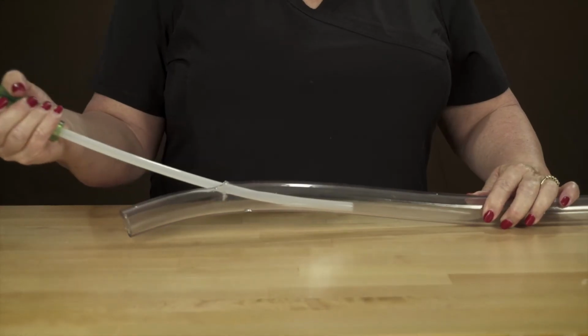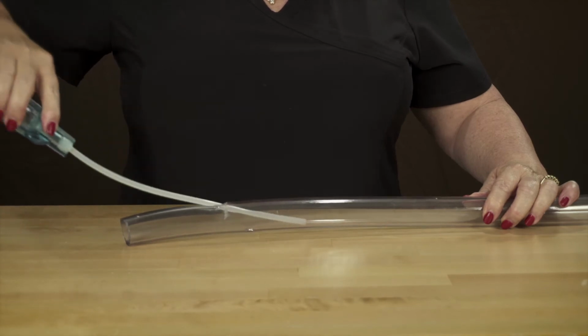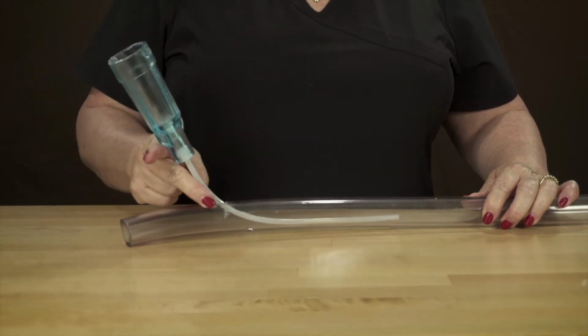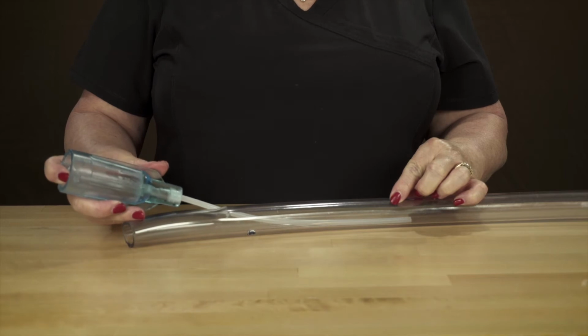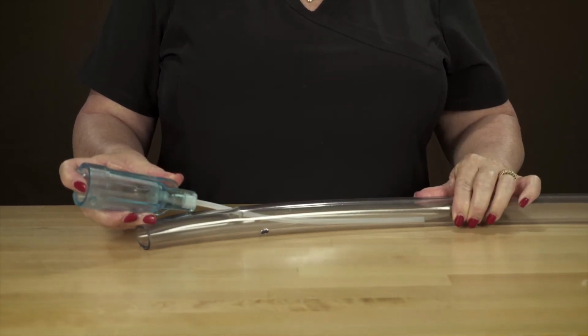Remove the large cannula and insert a small one for comparison. Again, point to the area behind the insertion site, along the cannula, to the tip where medication is delivered, showing there will be better hemodilution and less risk for chemical phlebitis, as well as less risk for mechanical phlebitis.